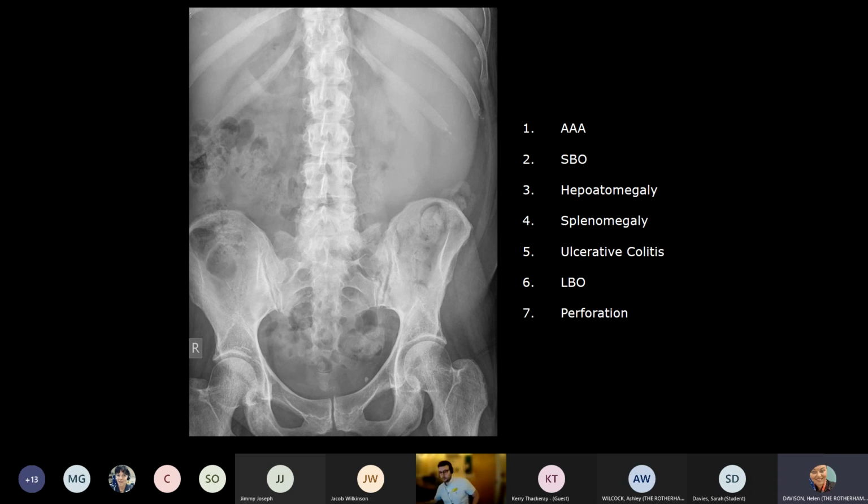This is just a real random guess, but can you see an aneurysm there? I can see why you'd think that, because we've got this. Do you mean here? Is that something completely different? No, you're right. We've got this density here. We've got the outline of one kidney here. So I think that this is a kidney coming round here, but this doesn't look quite right, does it?